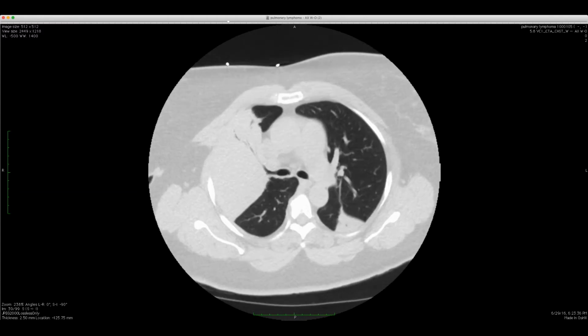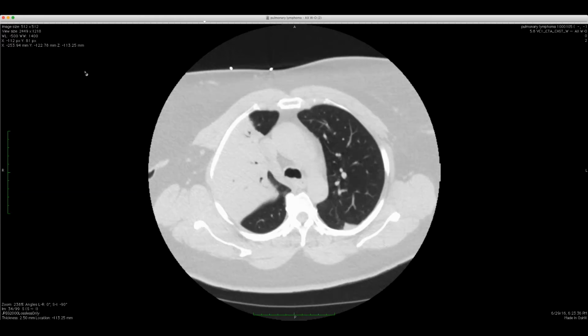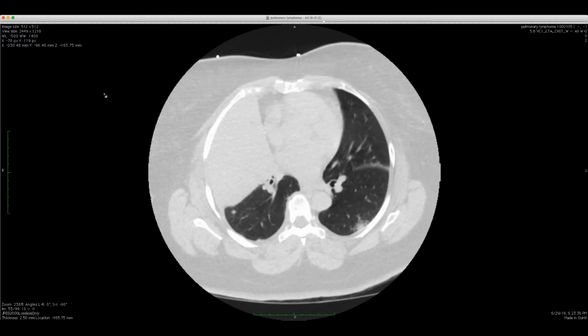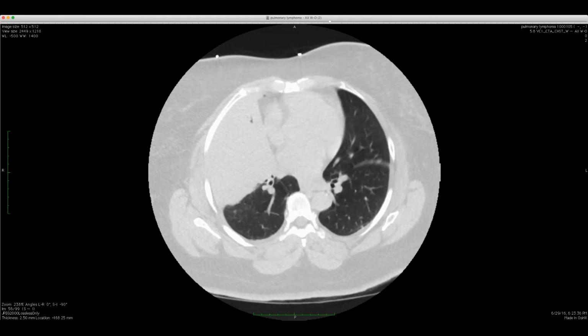Brent, how sick was that patient? Because I bet that's another clue that it's not a raging bacterial pneumonia. Yeah, not sick, not very sick at all. So that would have been the clue here. It's just another good example of how you need to correlate with the history to see if they're appropriate for this appearance. She did not have the appropriate history.